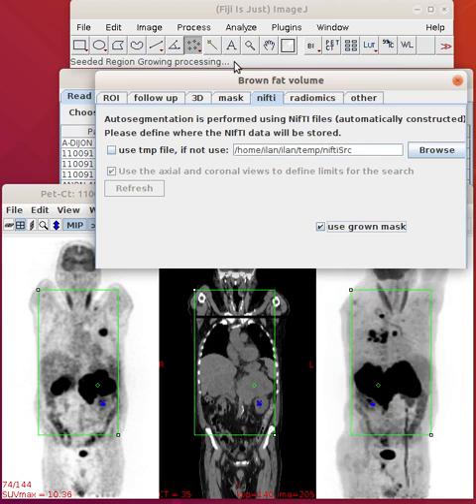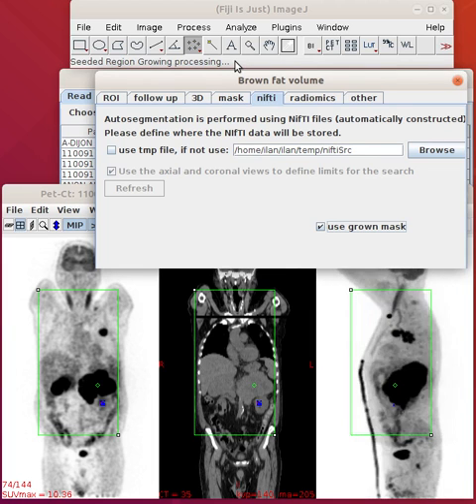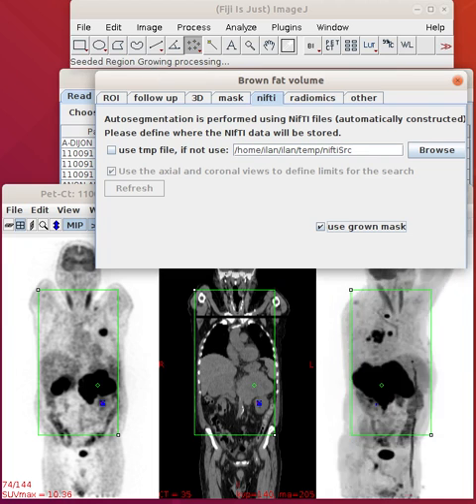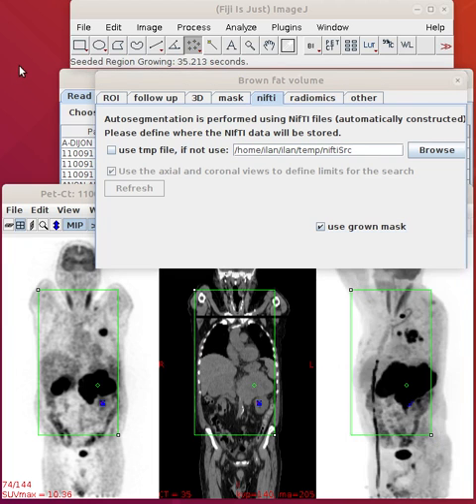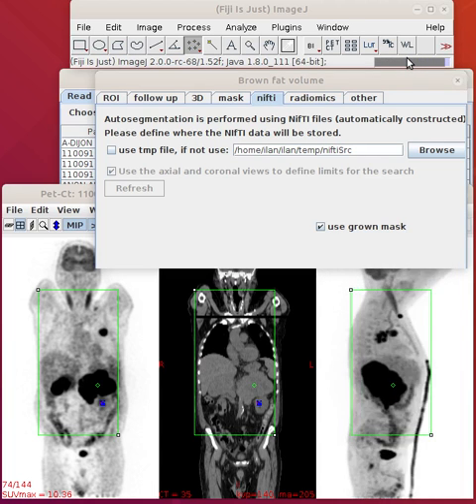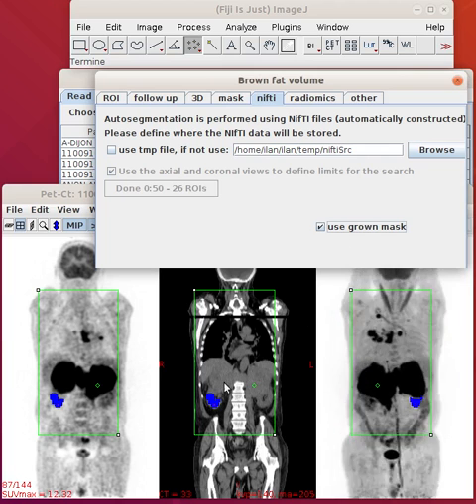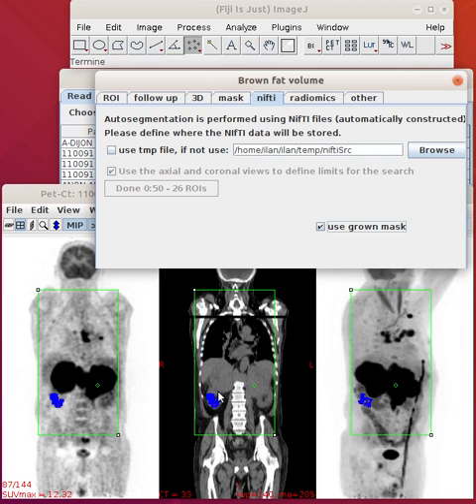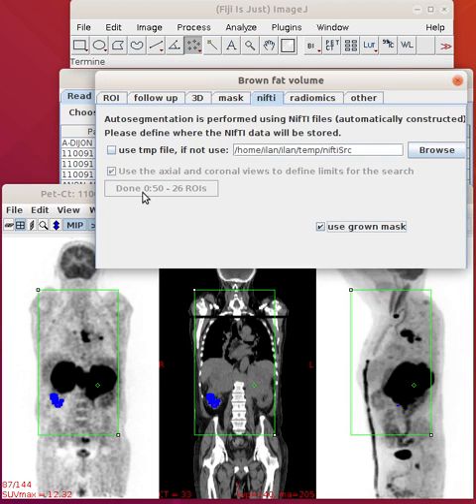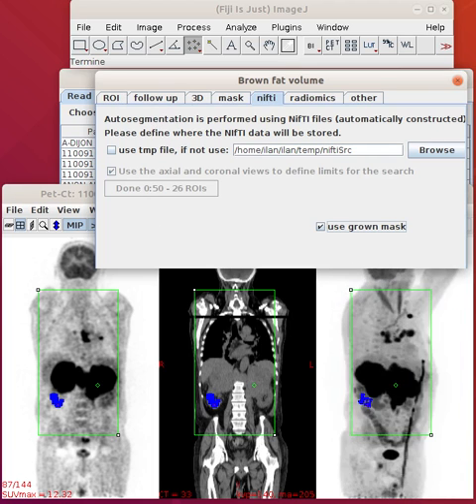Okay, here it's again finishing up. In a minute you'll see, you can see this is coming up, and now it's done. Now you can see the results without the bad region. And this is essentially the end of the demo.